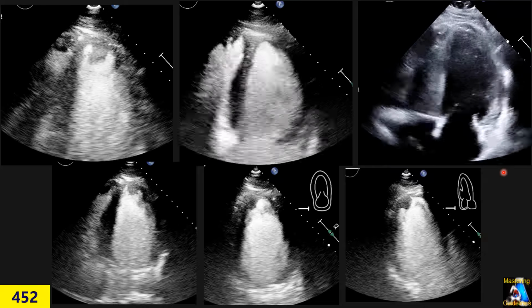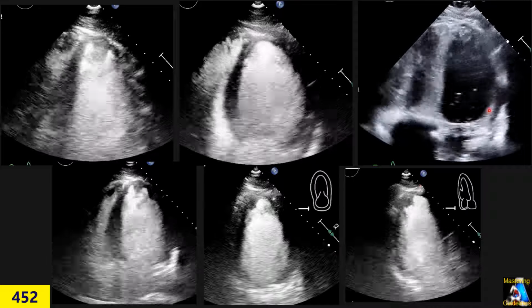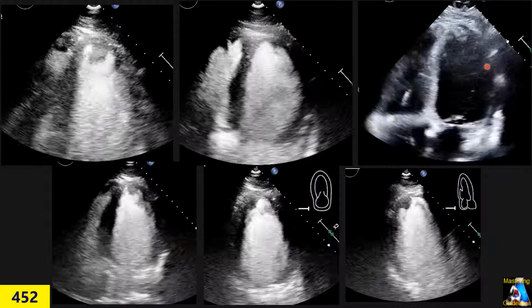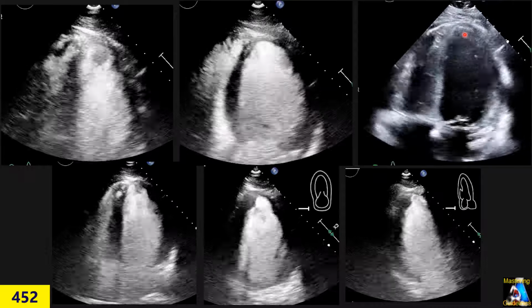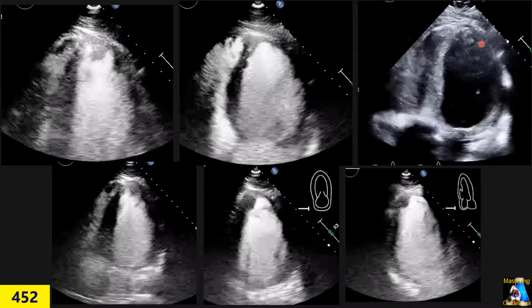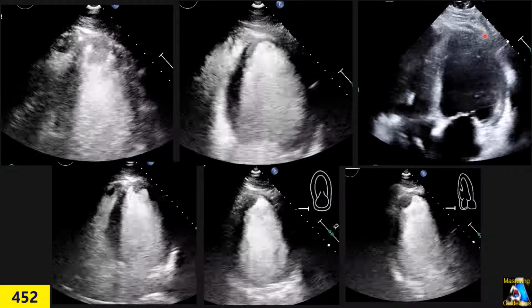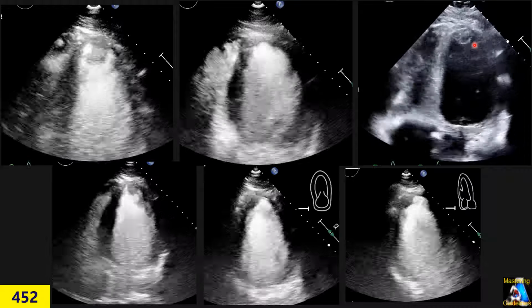Here in apical, we get these clips and images. First of all, in this four-chamber view, a little off axis and a specific view, we can see some echogenic structure at the apex. Just based on the 2D image, can we say with over 80-90% certainty whether that is real or artifact? What is the logical reasoning for your opinion?